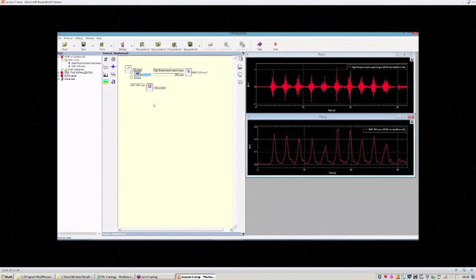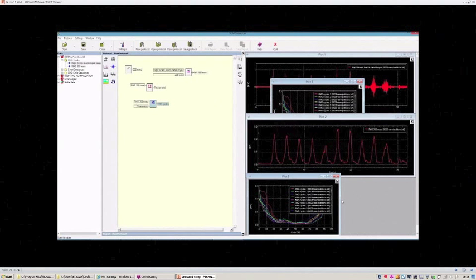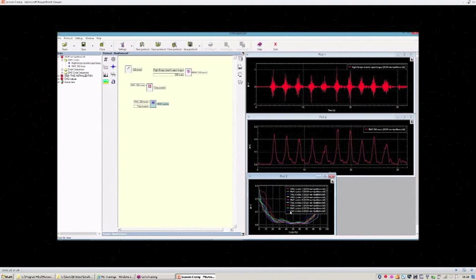So we can choose the defined cycles operator, root mean square cycles, where the two inputs are, first, the envelope of the signal, and second, the sequence of events. So now, as you can see, we have computed the normalized signals for the different cycles we have identified by the events, from the maximum to the maximum of the signal.